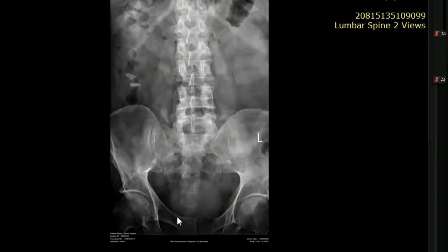This is very smooth and balloon-like, so this was a distended urinary bladder. But always give both the differentials, that this can be this and this can be this. So, this film is passed as far as exam is concerned.